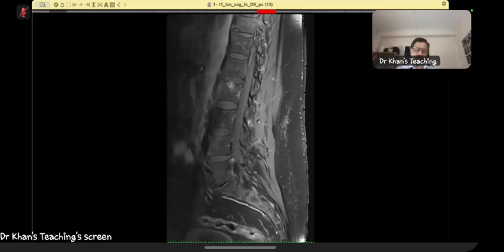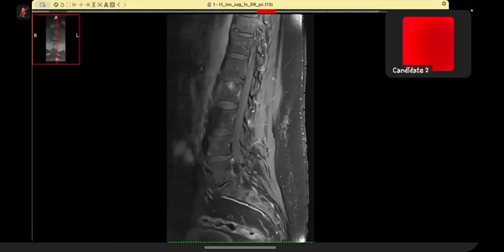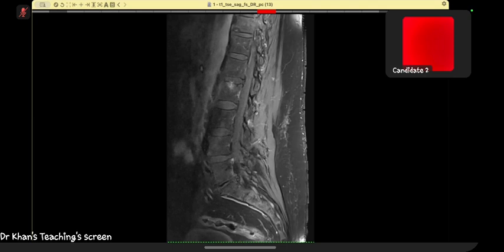Is there enhancement in the herniated disc? It is seen in the region of the herniated disc in the superior end plate. So I think this is an acute small Schmorl's node which the patient has, causing pain and symptoms.